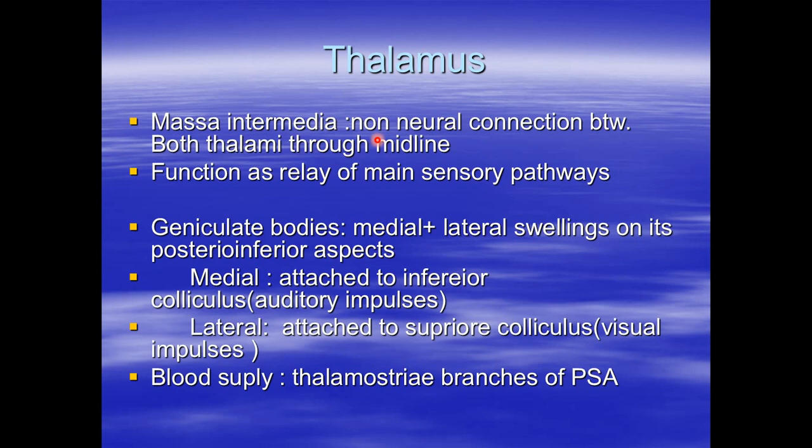Anybody? We talked about it last time. The corticospinal tract passes through the internal capsule. So the motor fibers go through the internal capsule with a specific distribution, as we said in the last talk.